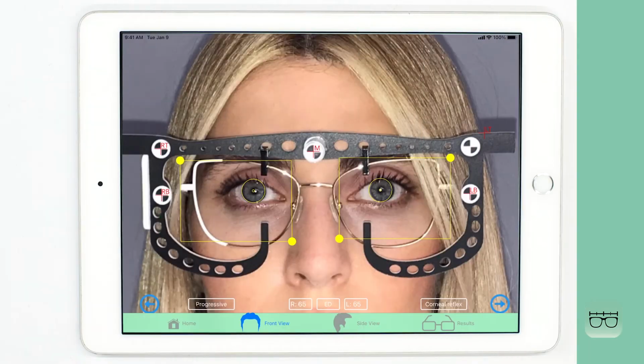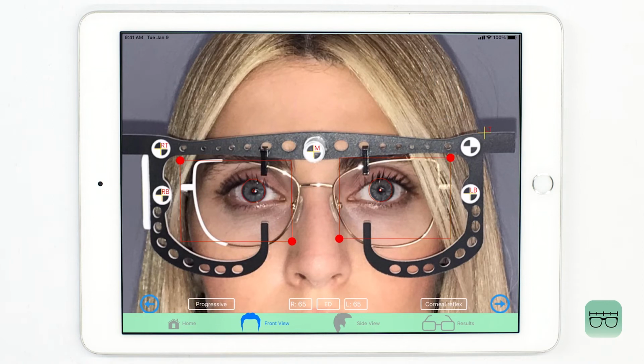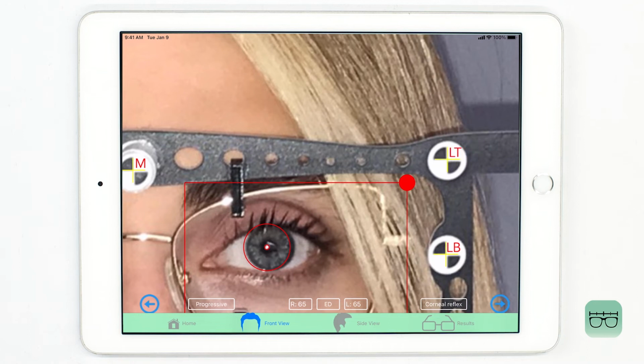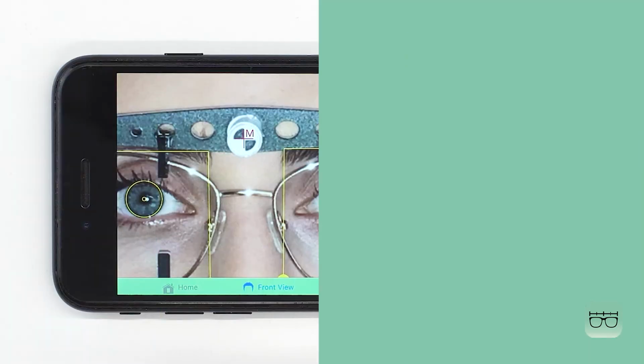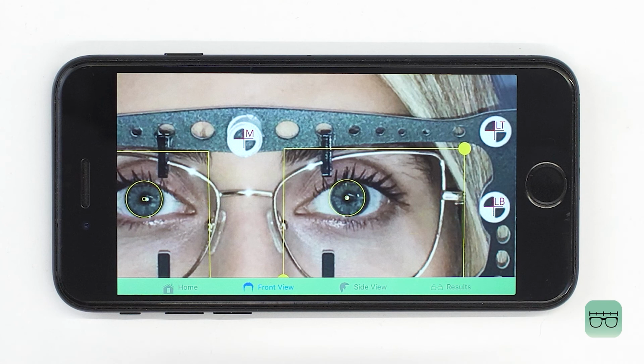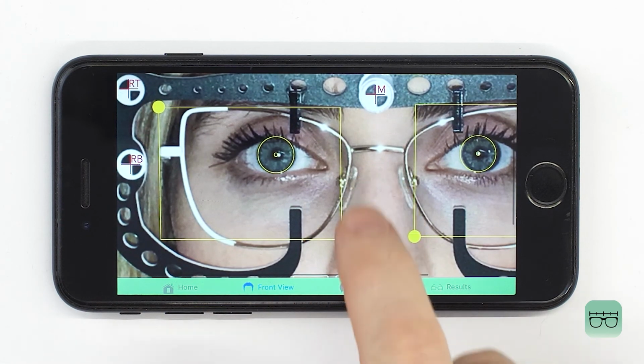If the red cross indicators are not placed correctly on the relevant sensors, we can go to the edit mode on the screen, and after placing the indicator in the correct place, we can return to the previous state with a triple tap. If we use a mobile phone instead of a tablet, it is enough to scroll the pages if necessary.